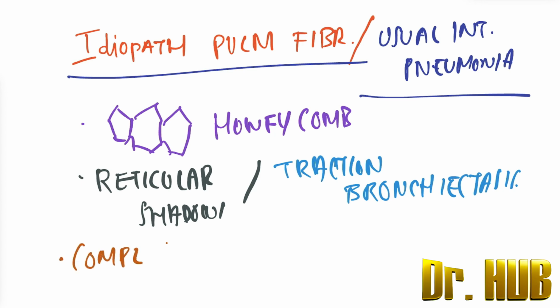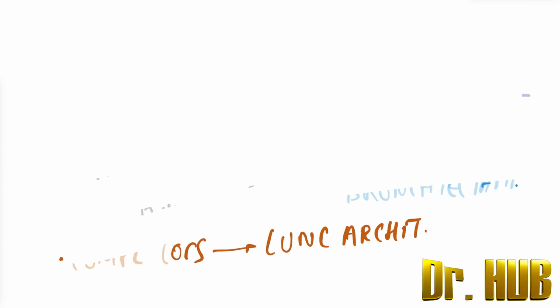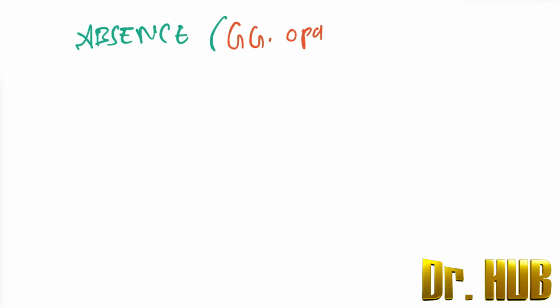Next, there is the absence of other non-specific findings, such as ground glass opacity, nodules, cysts, as well as consolidations.